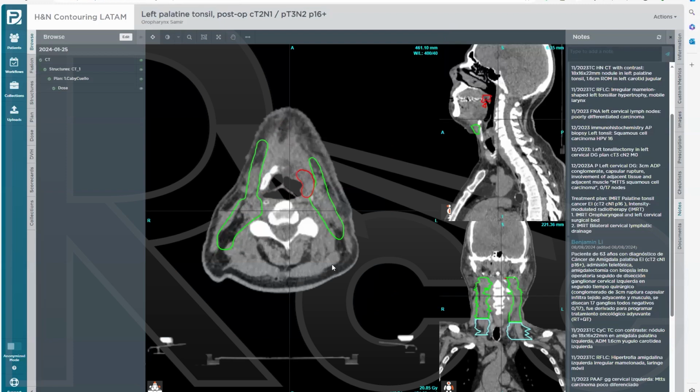Okay. And what do you think about the automatic organ at risk contouring programs that some of the software are coming with? That's going to help, right? I think I've evaluated some of the software and the results are very mixed. Sometimes it can be pretty nice and helpful, but the majority of the time it requires editing. It's not automatic, and you can't leave it alone. I agree with you, because I have tried some of them, and most of the time you also need to be careful because for a very regular patient maybe it goes well, but as you said, every patient is different and the anatomy could be changed between one and another.